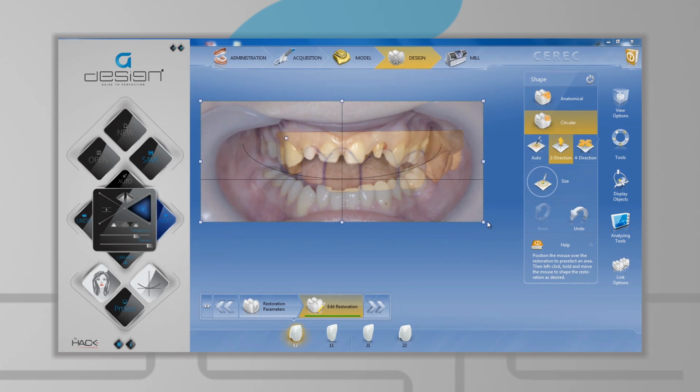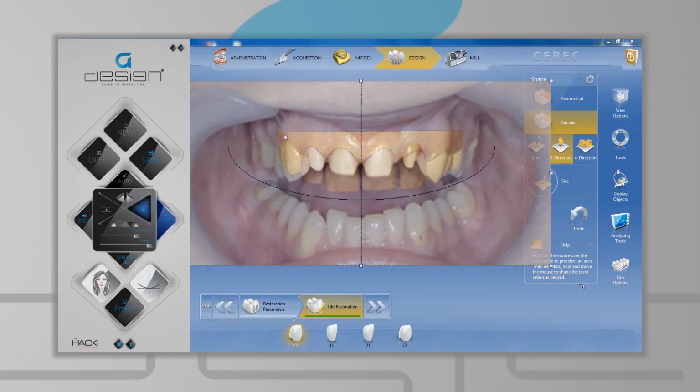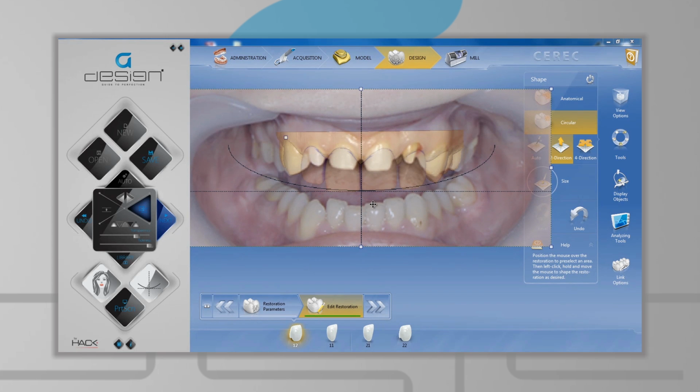The calibration will follow the gingival margin, the midline papilla, and the unmodified teeth, and will be done by repositioning and side adjusting the image of the mouth cropped from the portrait photo of the patient.